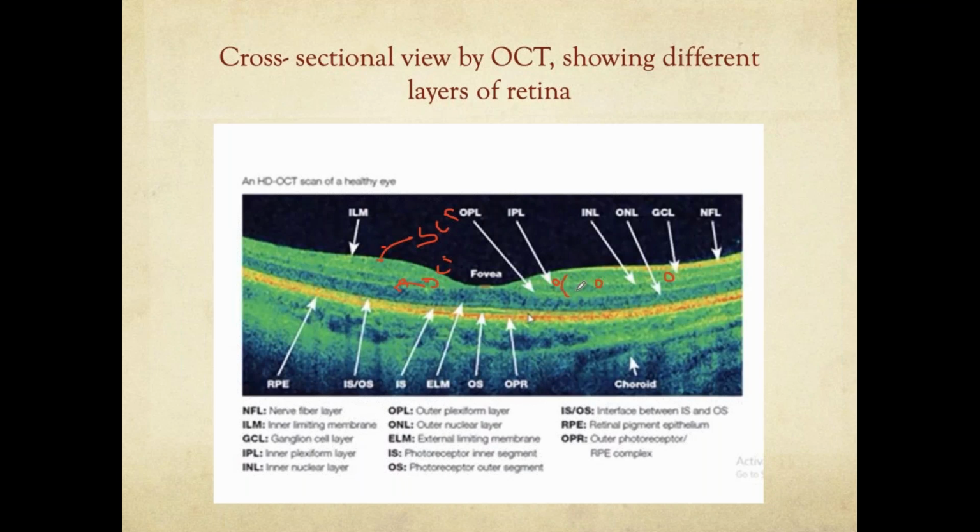But now if I start having all of these splittings, the more the splittings, the more chances that this retina will have a poorer visual prognosis. What happens is this edema, when the retina still has an active edema, then you consider it as cystoid or spongiform.